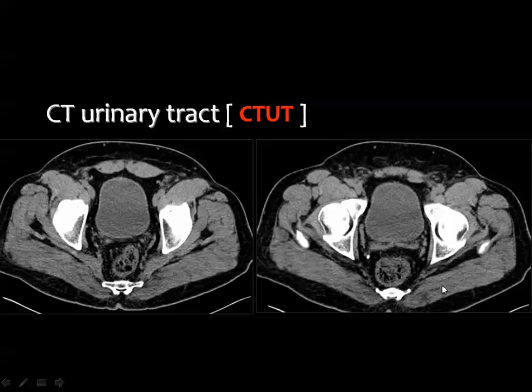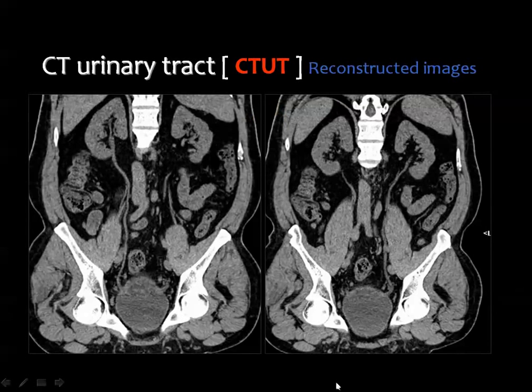Then if you look here in this particular image, you can see a radio-dense shadow on the right side of the pelvis. This shadow may represent a stone, and it may also represent a phlebolith, which is frequently seen in the pelvis. Then we should have these images, and these images are very valuable, obtained by CT, reconstructing the previous images into longitudinal ones. Then you reconstruct the image along the ureteric course, then you can see the ureter along its whole length down to the urinary bladder.